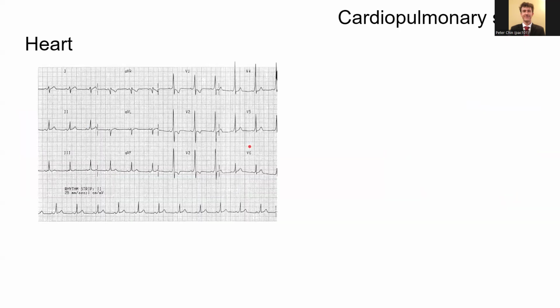Okay, so here's another EKG. No symptoms this time, but that's just because you either know it or you don't based on the morphology of the EKG. This is Wolff-Parkinson-White.